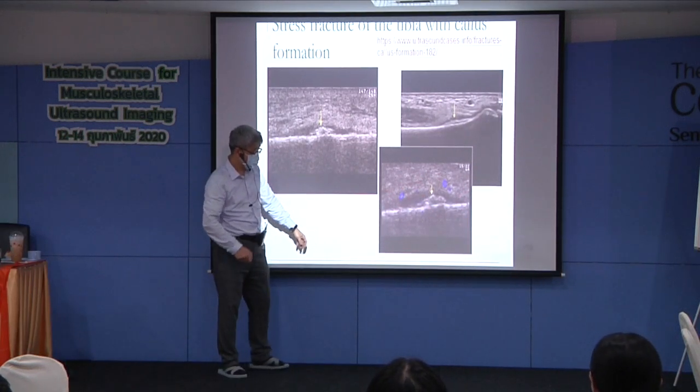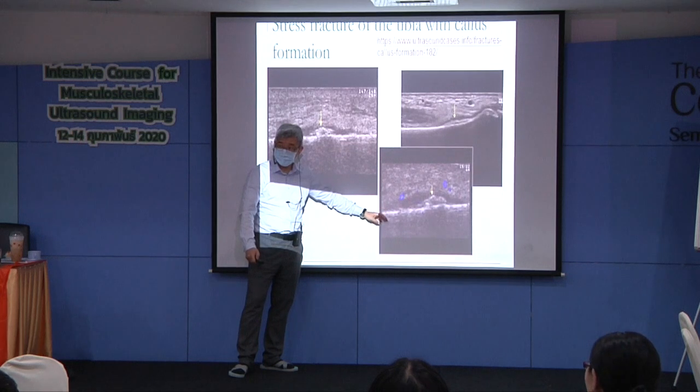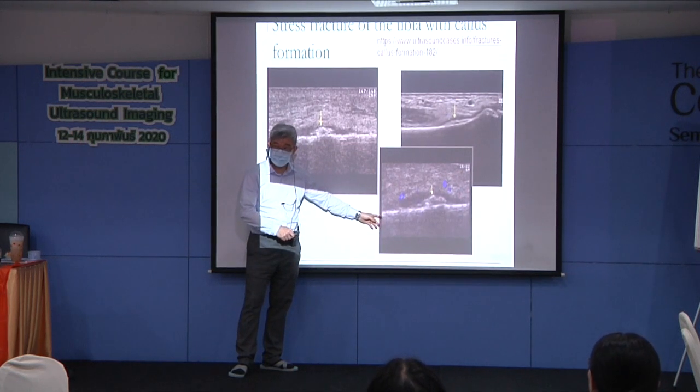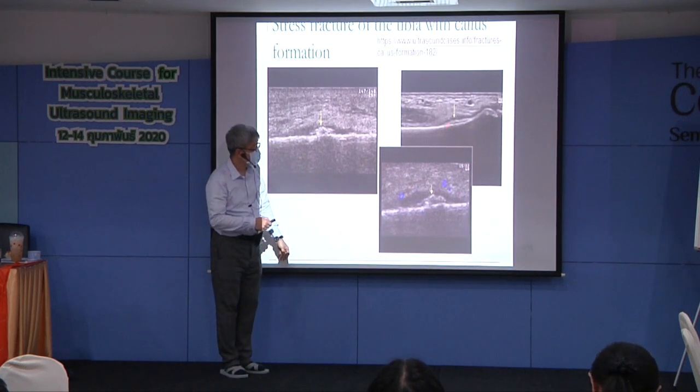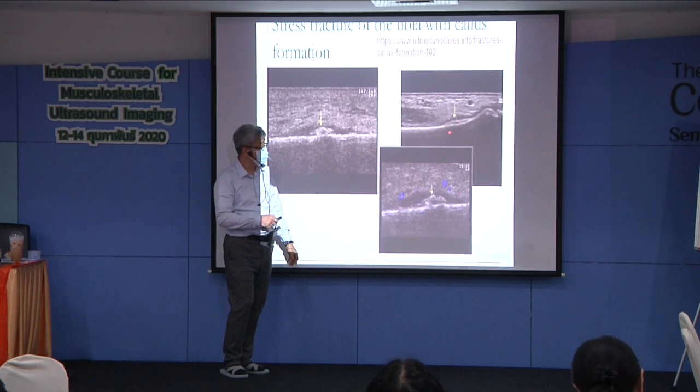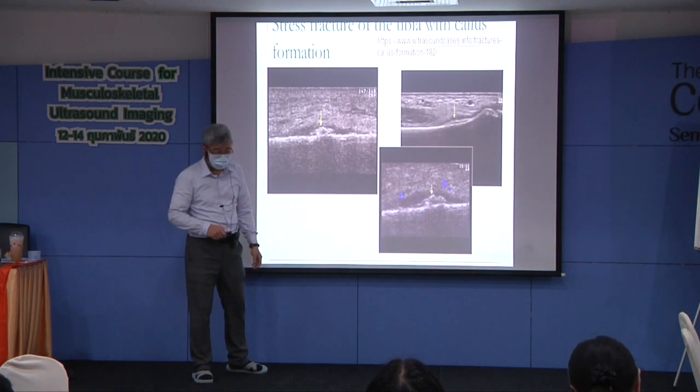Color Doppler showing flow means not stable. Okay? Partial weight bearing exercise, maybe with Theraband. Okay? No fracture sign, but focal thickening of the periosteum.